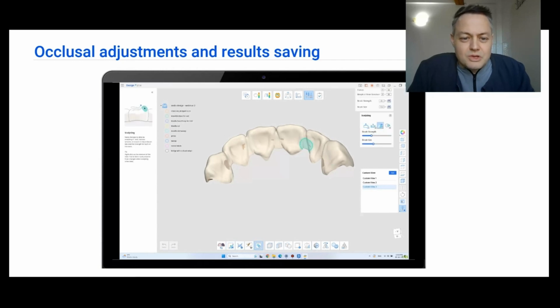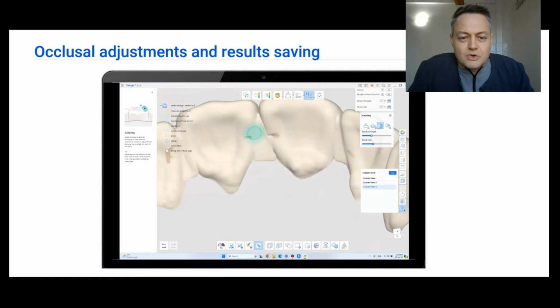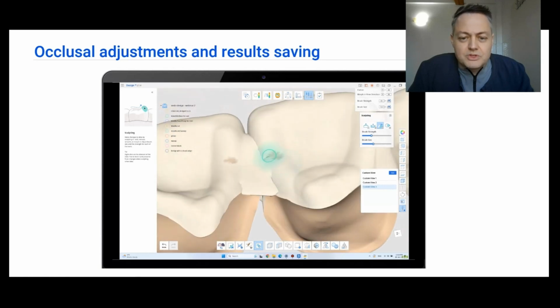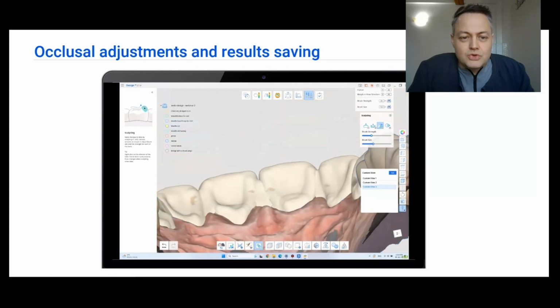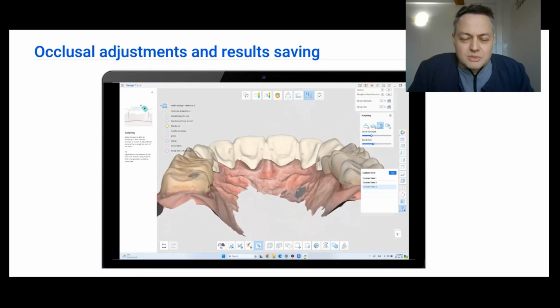So we cut them with the mandible, then we are going to have some rough spots, as you can see here, and these are going to be smoothed out by the smoothing tool from the sculpting tools. And after we smooth them, sometimes there is going to still be interference, so you can do this multiple times: cut by antagonist and then smooth, and then cut again and then smooth some more.